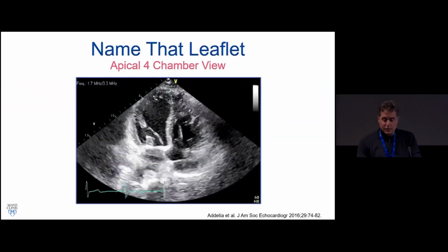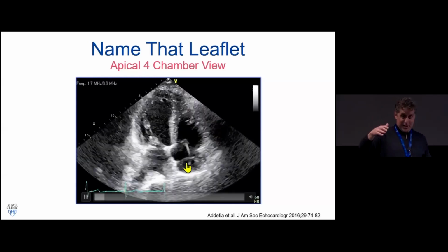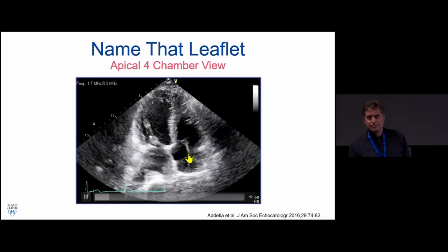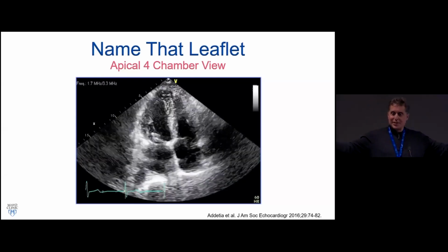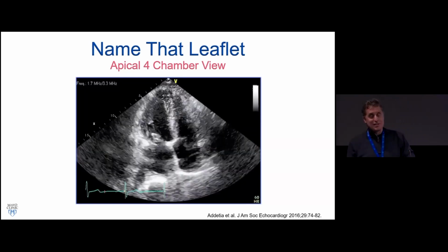So let's take a look. This is right ventricle, right atrium, and I'll just say it out loud because I have some of my Mayo colleagues here. These are the Mayo standard views. These are going to go away because with artificial intelligence that we've heard this morning and the algorithms, I hate to say it, after 25 years of imaging in the Mayo way, I can see that changing. Sorry, guys, but I think that's going to happen for us.